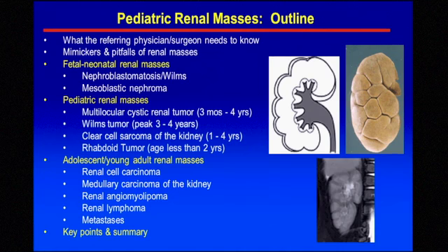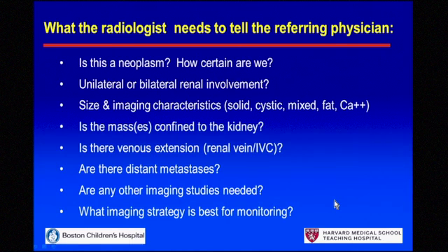about metastases. We do have some pictures of renal lobation, a diagram on the right here. It shows the normal lumpy contour in a diagrammatic form, and in a photograph you can see a path specimen, and then on a fetal, actually neonatal MRI at about 6 months of life, the same normal undulation. This is a normal finding.